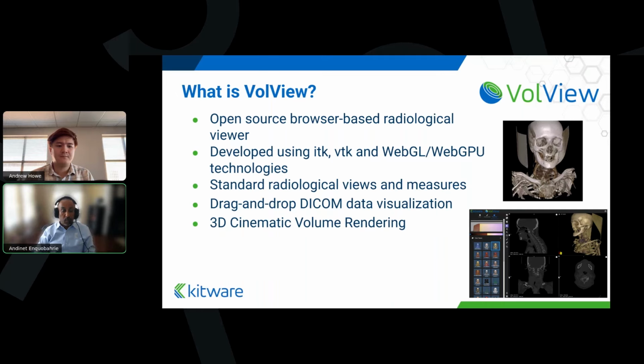The cinematic volume rendering generates very beautiful renderings that researchers and also clinicians use for a couple of reasons. One, for patient education and patient communication, but also for training of radiologists. You can just drag and drop data in DICOM format or other types of medical image data into your browser to do your visualization.